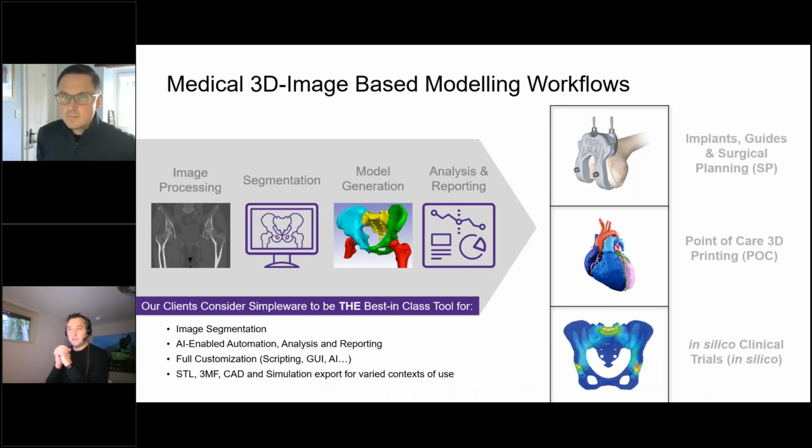In terms of the workflow that we work with, it's a medical 3D image-based modeling workflow. On the left here, you'll see this gray arrow. That's where the Simpleware software sits. On the left, you can import image data. This is from CT or MRI data, computed tomography or magnetic resonance imaging modalities.